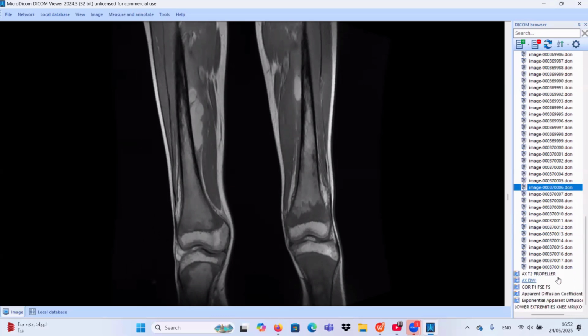Very good. This is not pure fluid, maybe containing blood or fat. Yes, agree. Totally agree. Okay. What is the age of this blood? Is it acute, subacute, chronic? I think it's late subacute or something. Okay. Methemoglobin. Okay. High signal in T1 and T2.